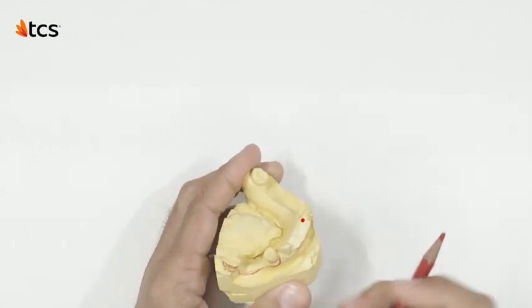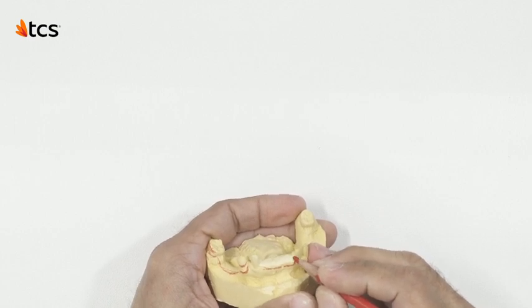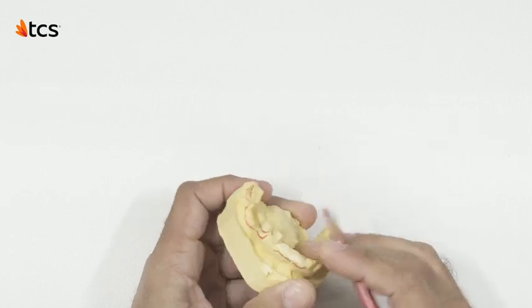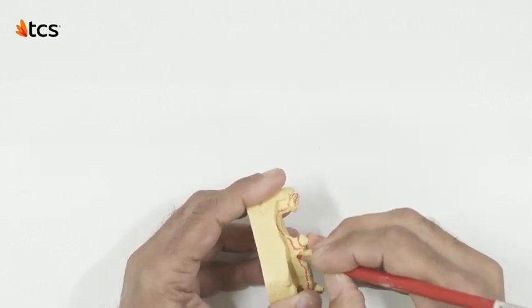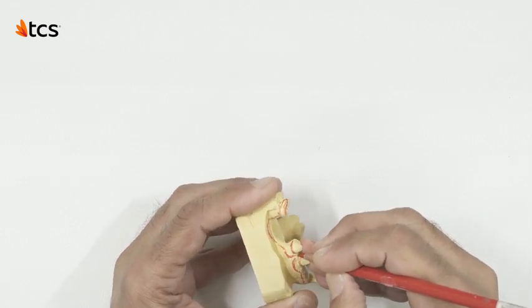Due to the angulation of this anterior tooth, avoiding a clasp for retention is advised, as it can cause complications in the path of insertion when fitting the partial. Instead, choosing to utilize this anterior tooth for the anterior clasping is ideal, as its angulation is less drastic.